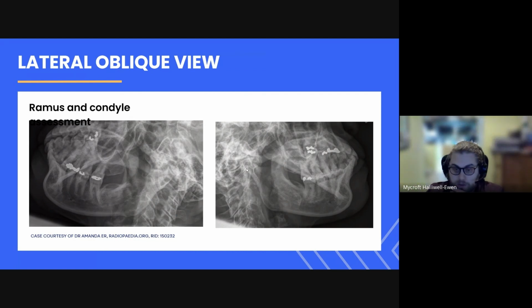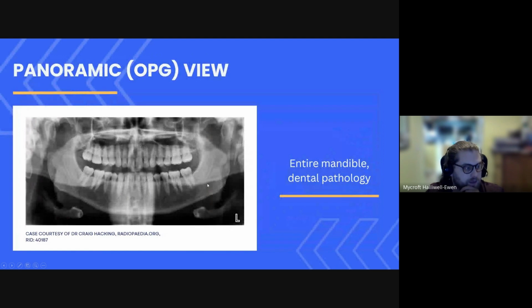But this may be all you have. Ah, there you are. That's what you have. See, much better, right? Gives you good dental pathology.